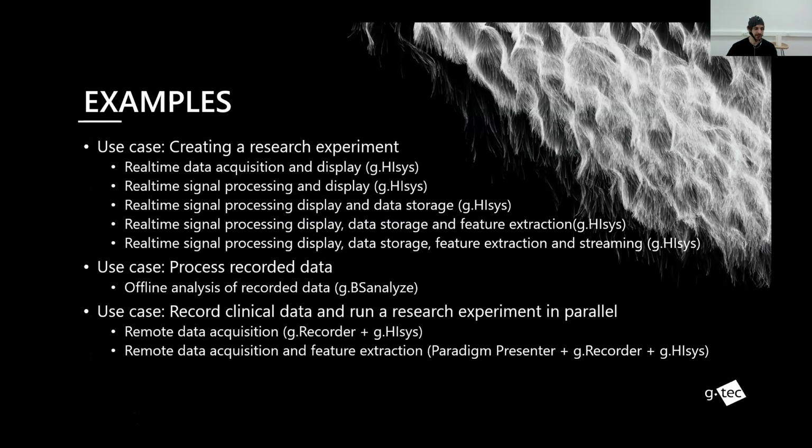And as mentioned before, this session is a hands-on session again, where I've prepared some demos. I'm going to present g.HIsys first. In g.HIsys, I want to show you how to establish some real-time data acquisition and display. Then I want to extend this model further and further. First of all, I'd like to add some signal processing and data storage, and extract some features, in this case, band power features. And then I'd like to show you how to stream the data from g.HIsys to some external application.